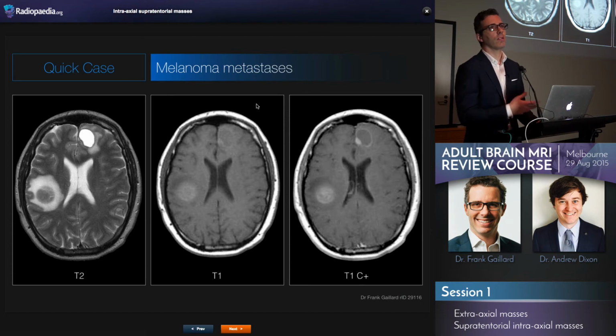And in Australia, we see a lot of them because of melanoma, although that's not as common in other parts of the world. The other typical primaries are thyroid, choriocarcinoma, and renal cell carcinoma. And by that we mean that the majority of the metastases from these primaries are hemorrhagic, but breast and lung can also be hemorrhagic sometimes, and because they're such common tumours, you see hemorrhagic versions of those metastases not infrequently.